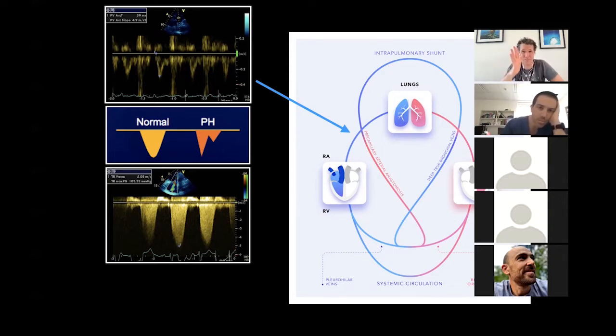I was going to add in about the interatrial septum pushed over to the right. In the apical four-chamber or the parasternal long axis or the subcostal view, that can indicate raised left atrial pressure. So seeing a left atrial thing wiggling around is probably important.